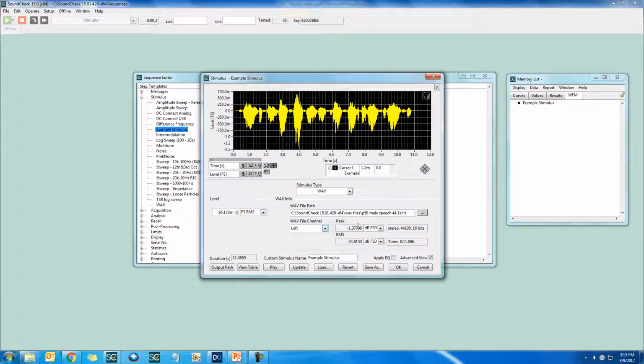You can change the units of the peak and RMS levels to see them displayed differently. One thing to note is dBASL. This is required in some IEEE or TIA standards. It ignores pauses and the level is only for the active portion.